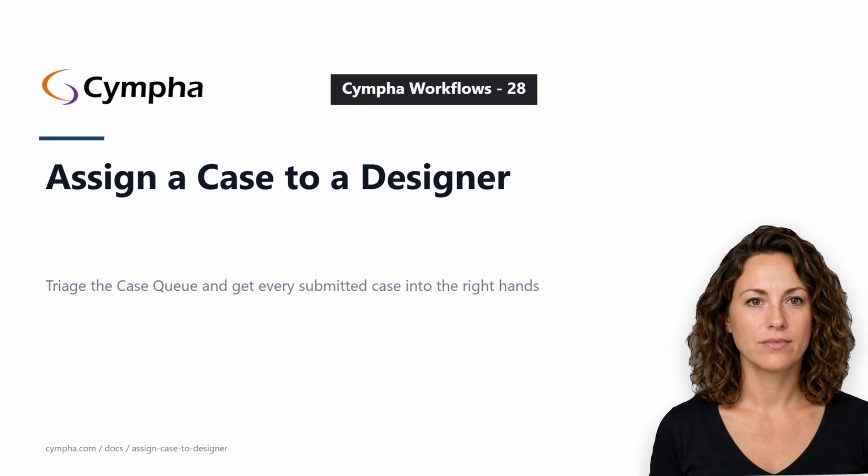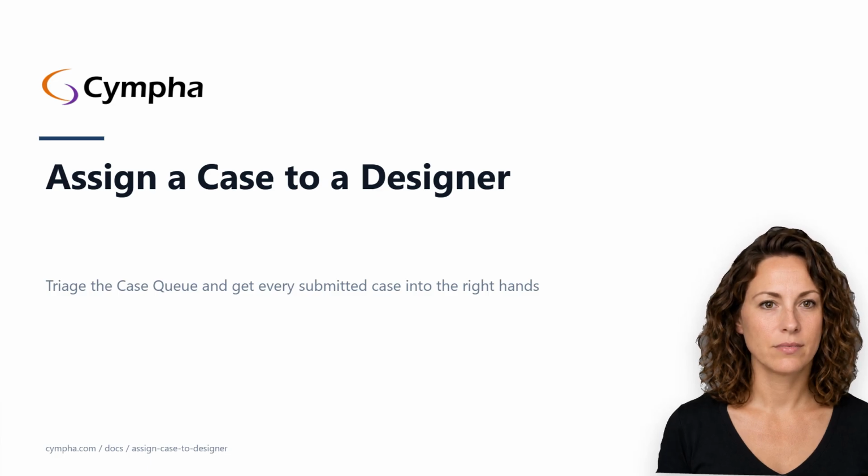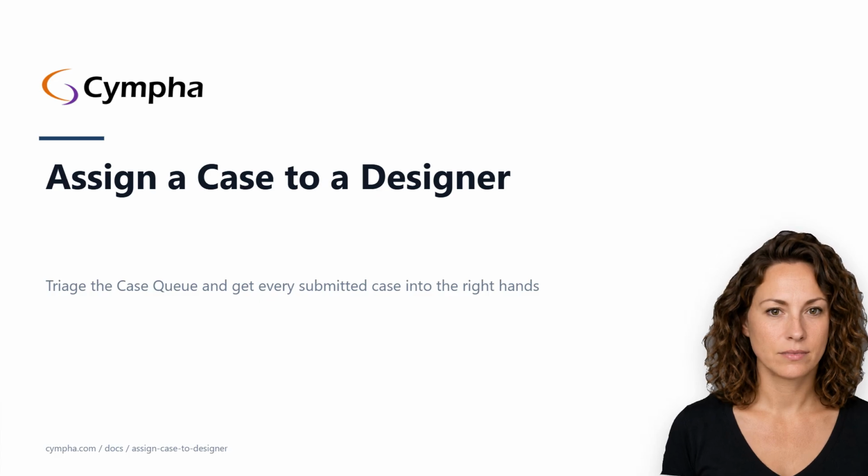Welcome to Guide Mia. Today we're going to talk about assigning a case to a designer. This is the lab manager's daily bread on Cympha. A clinic submits a case, it lands in your queue, and your job is to look it over and put it in the right hands.